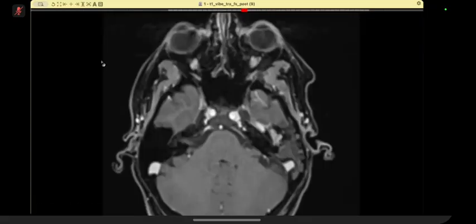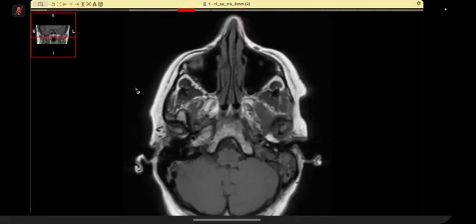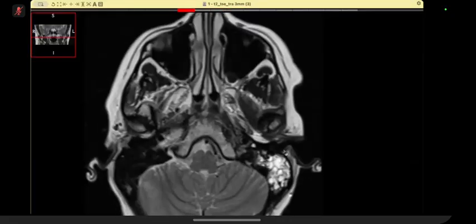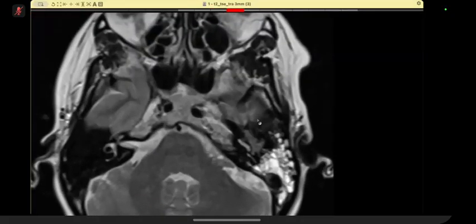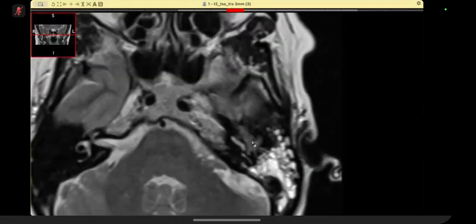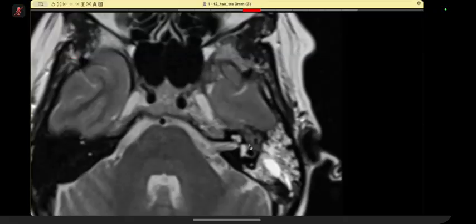Now, if you see the T2 weighted sequence, it told you that it is slightly different in characteristics as compared to the rest. And again, it beautifully shows you the anatomy on an MR. It is completely filling up the middle ear. Anatomy doesn't change, the modality changes.